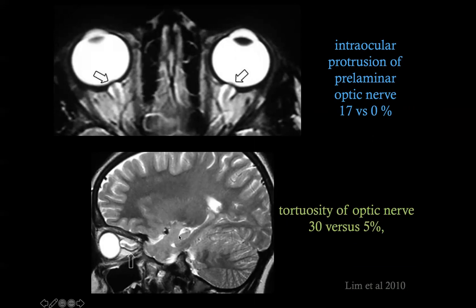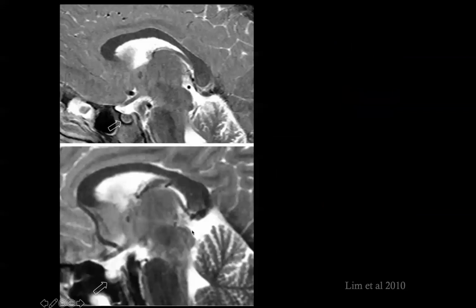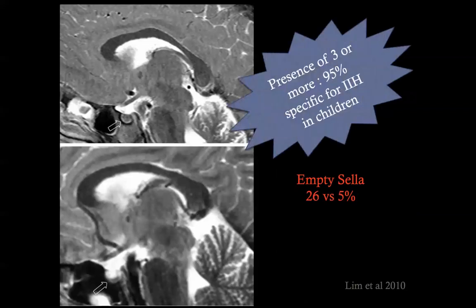Tortuosity, especially the vertical tortuosity, again, only 30% of patients with IIH, but a small percentage of normal children can have this tortuosity. And finally, the so-called empty sella, again, is present in patients with IIH, but also in normal children. First of all, remember the definition.